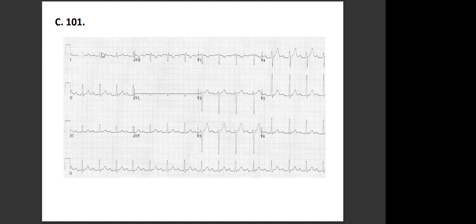Okay, lead 1 is positive, but close to 0, a little bit more positive. So this is why it's less than 90, but it's close to 90. So let's say about 80 degrees. Okay, so when you start with rhythm, heart rate. Yeah, you said about 90, 95. Good. Next one, impulse formation center.